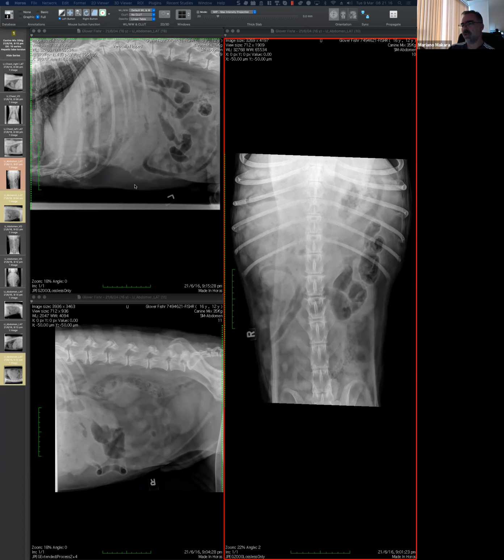And I guess there is going to be a third option, which will be something primarily wrong going on with the colon. I don't know, you haven't mentioned, but I could think about an intussusception or something like this. So I agree with your findings. There are these mainly gas-filled bowel loops, whose diameter is larger compared to the small bowel, which seems to be sitting in the left cranial abdomen. So given the options, which option do you think is more likely?